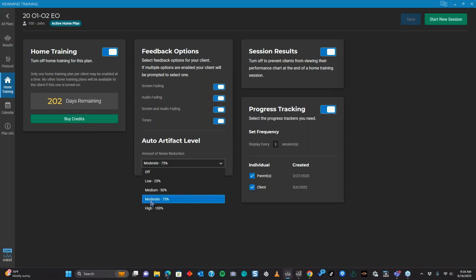We did talk a little bit about auto artifacting. I'll just reiterate that by default, it's always going to be set to moderate at 75%. On the troubleshooting side of home training, this happens quite a bit for those of you that do home training.